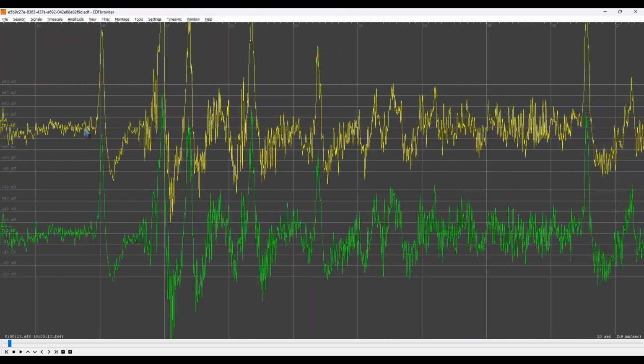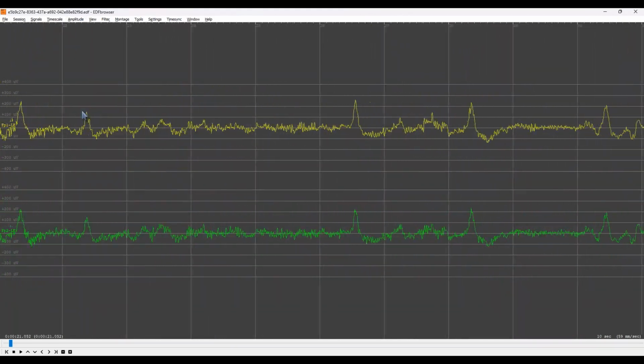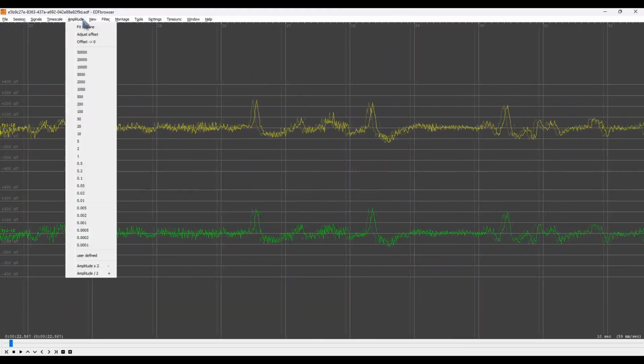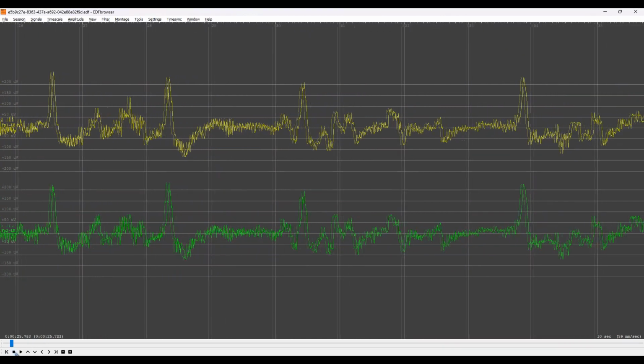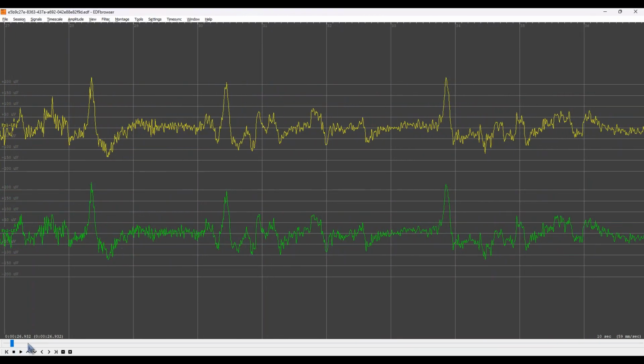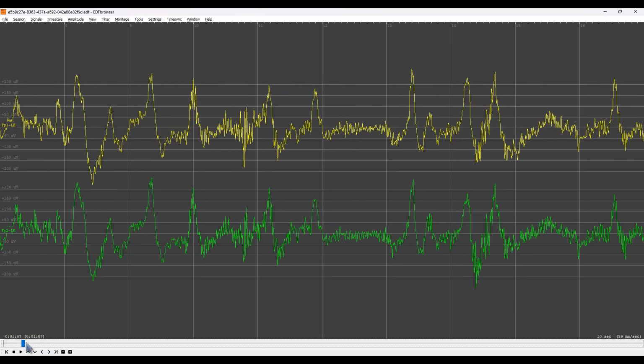So all you would have to do is click on that, choose Open. So here we can see it was just a 2-channel protocol, FP1, FP2. They're already pre-highlighted, so we're just going to click Add, and then we're going to click Add Signals. And there's our 2 signals.